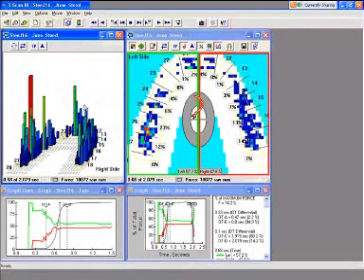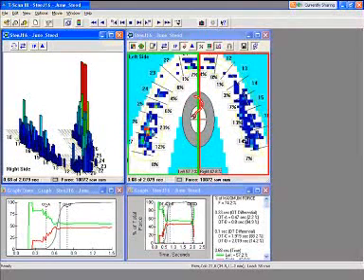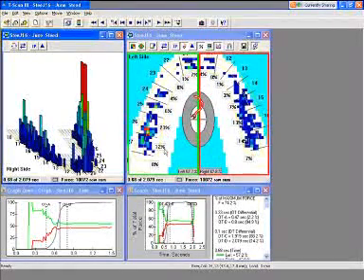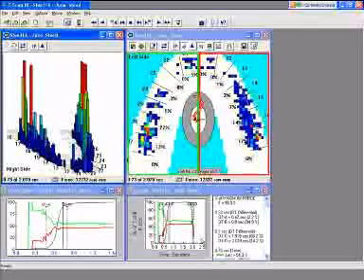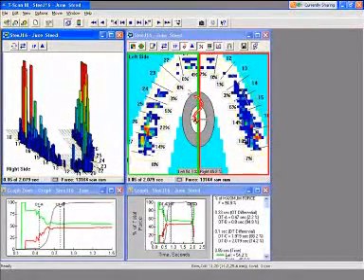But when you show them this graph and you say, look, you've got all these forces here. This tooth is on its way to possible breakdown. We want to get in and do something about it now before it breaks down. That alone allows you to use that information to educate your patients to have whatever procedure they may have. And everybody's going to present with obviously different things. So that's a good example of how you can use the TScan data just having a patient bite.